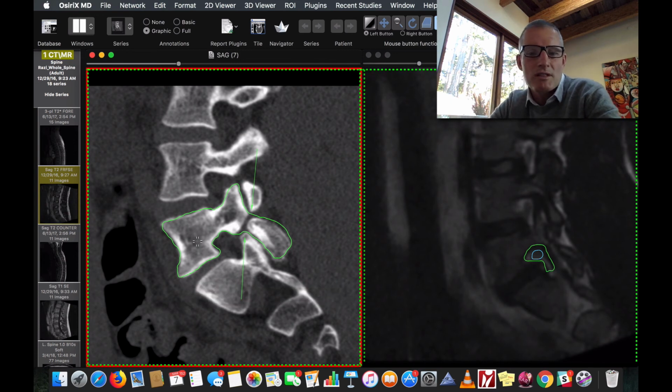So the treatment for this condition is usually rest and avoidance of the activities that are causing pain, maintenance of a good core strengthening program, and trying to stay as active and as fit as possible. Bracing does help in a situation where someone's in an acute amount of discomfort, and some trials with bone stimulators have shown some success. Anyway, the point of this quick little exercise is to demonstrate how difficult it is to see that pars defect on an MRI scan and how immediately apparent it is on the CT scan.